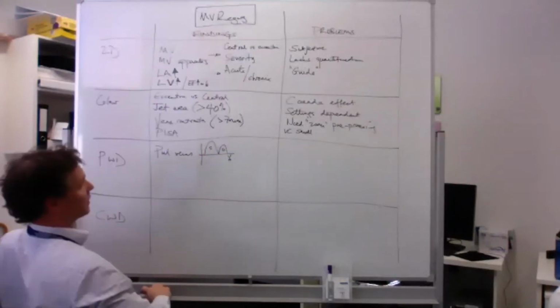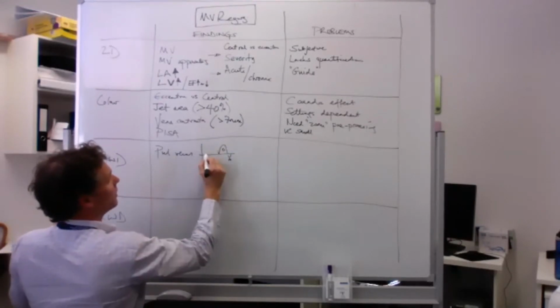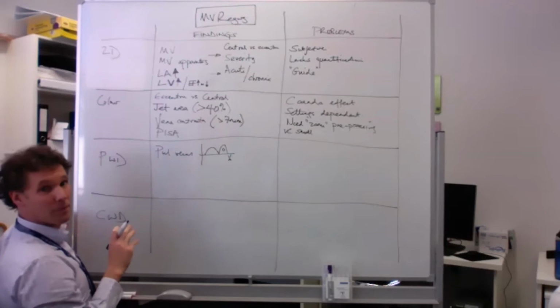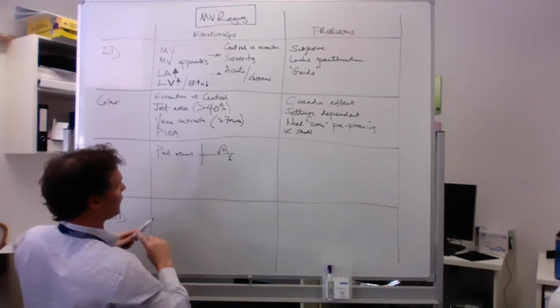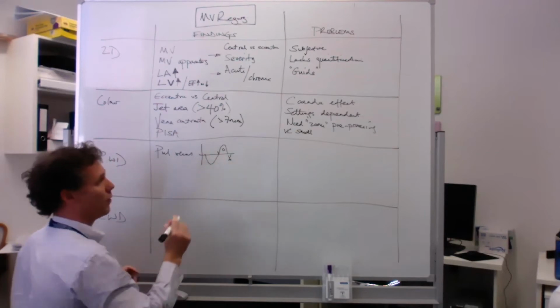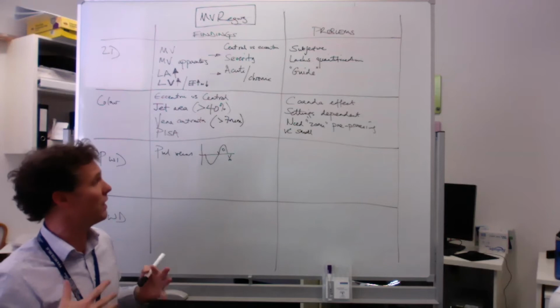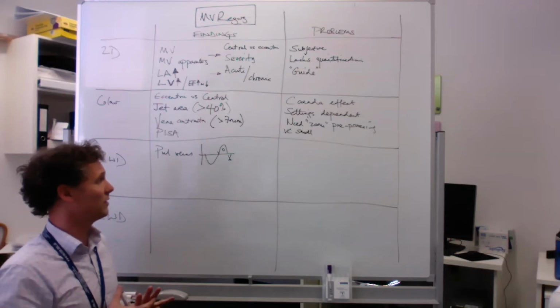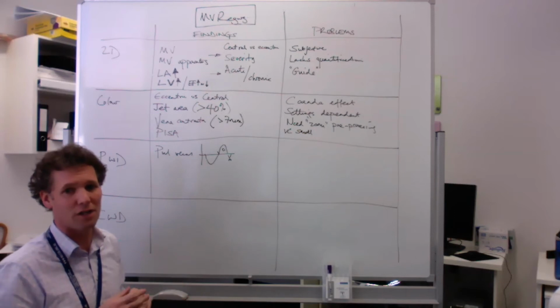As you get increasingly severe mitral regurgitation, you get S blunting first. S blunting versus reversal. It's going to be blunted, and then if it goes severe, it goes the other way. It's really nice. If you're not using this a lot in your assessments, just keep trying to use it. I find it really useful.